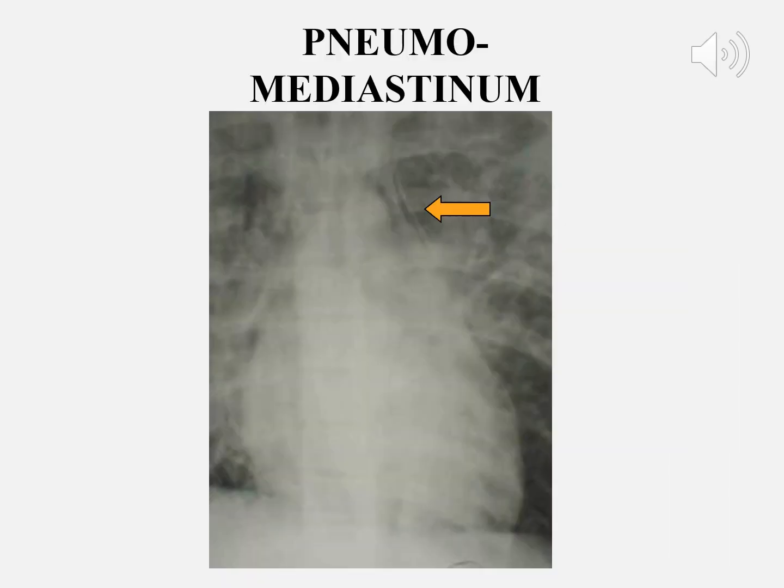Pneumomediastinum, this is way advanced from what we need for this course, but you see it there. Not that common. Normally it's a big deal. They've got something else going on. But pneumomediastinum, a very subtle finding.